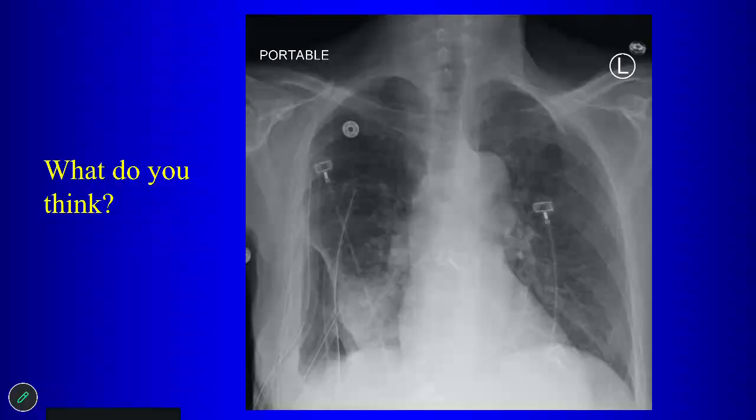Okay, is there a pneumothorax? Anybody see a pneumothorax here? Yeah. Where? Isn't it the right base? Am I wrong or? So, are there any lung markings here? I really don't see any. No, and there are two other chest tubes, right? There's one chest tube here and there's one chest tube here. Yes. So here we have this lucency with no lung markings. So what do we think that represents? Subpulmonic pneumothorax. Well, it's not subpulmonic, it's a loculated pneumothorax there over the right costophrenic angle.